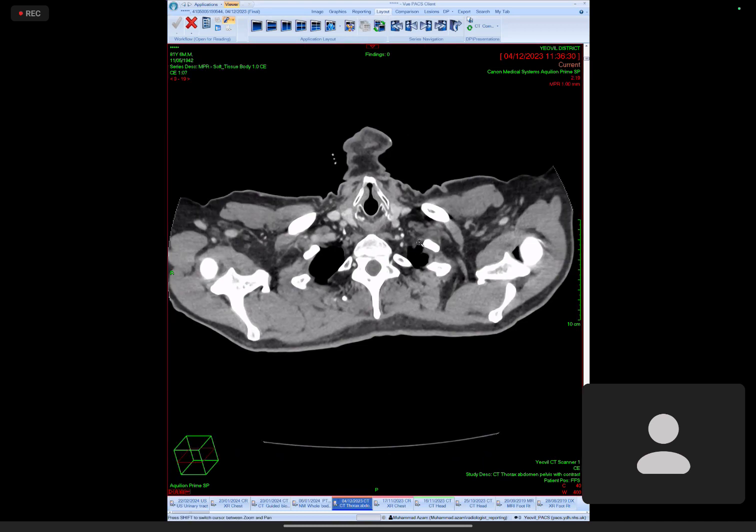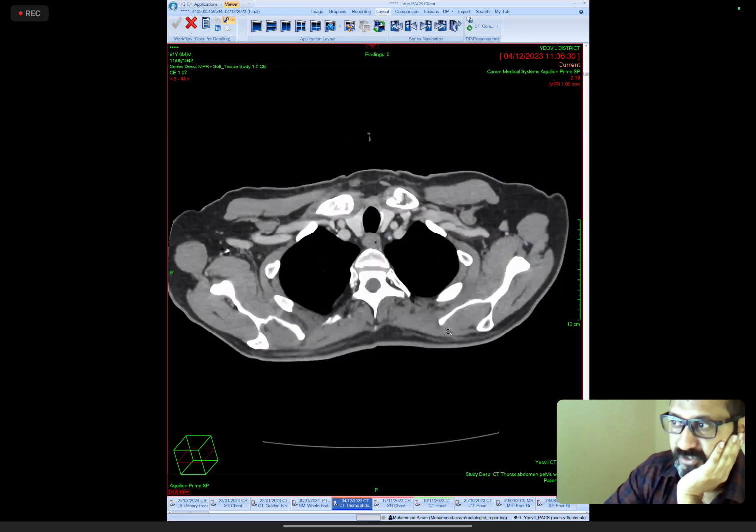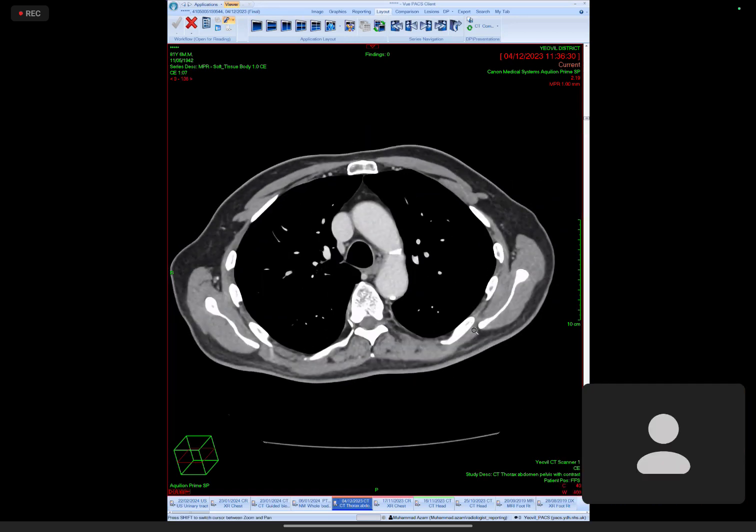I was actually worried about the left hilar enlargement, but I wasn't too sure because there was some rotation. So I thought that maybe I was overthinking. But okay, there was a retrocardiac mass opacity. Yes, sir, it's an X-ray.